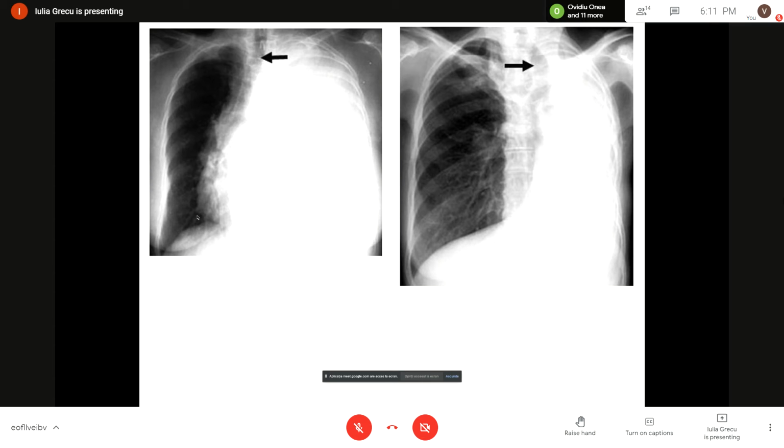What kind of test will be the next step, in your opinion? You mean like a paraclinical test, or anything you think is best? What would you do, like a doctor, if you see this chest X-ray?